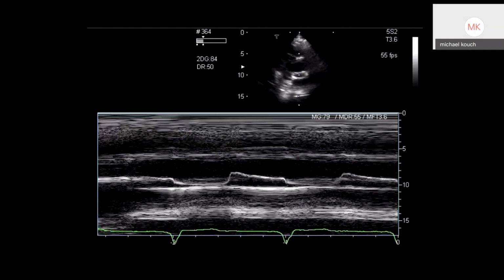All right. So what do we see here? So people who are at home are a little bit off the hook. So there's something different in our diastolic phase, right? Yeah. We don't see our normal two peaks. We see one slow descending line here. And this is very typical for mitral stenosis.